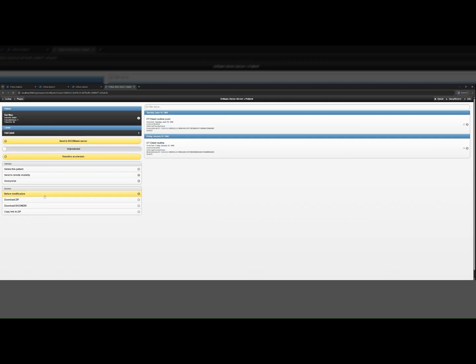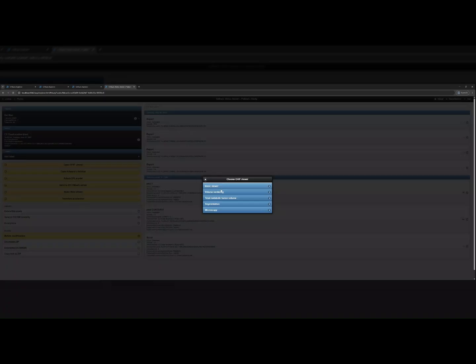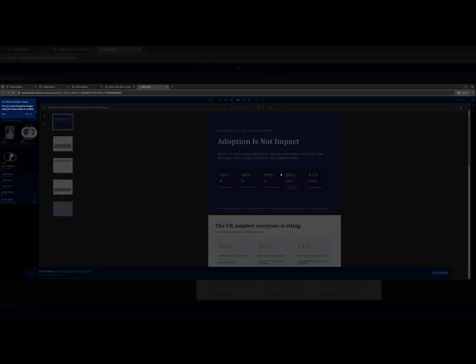But not much differentiation here, if you will. So for example, if I click on any given study out here, right, you can see that my buttons change slightly, not much. I've got a few different viewers now, whatever's integrated that I can open, right? So for example, if I wanted to launch OHIF viewer, no problem. And I do have different components, right? So I can select basic viewer, for example, and it'll launch OHIF viewer, which a lot of people incidentally do nowadays. This is obviously just some kind of DICOM wrapped image.